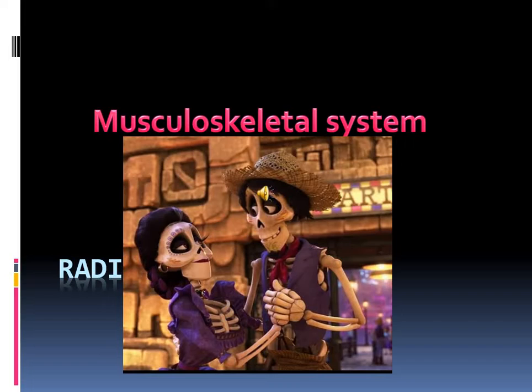I tried to simplify the slides, and we will start with some slides on the anatomy, for refreshment of your knowledge about the anatomy of the bone, and later on we will try to discuss the pathology in titles, which are very important, and try to reach the diagnosis as much as possible, because there are in fact many entities in this system. So please try to concentrate on the image, on the main description for each lesion, and we will discuss any things later on.